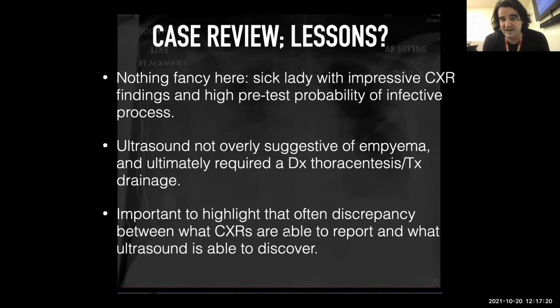And this just highlights that often there's this discrepancy between what we see on ultrasound and what we see on an X-ray. And this is a fairly common finding in the ICU, and I expect it's fairly common amongst most medical wards or most people who admit patients with these kinds of infections.